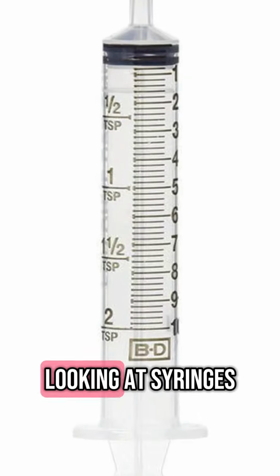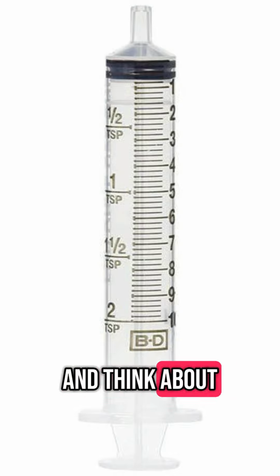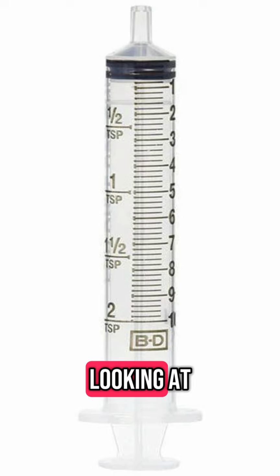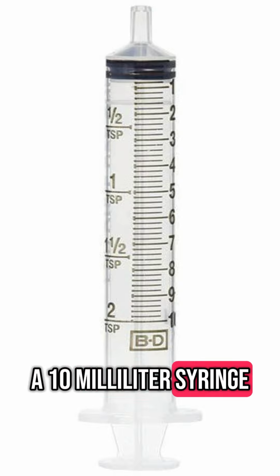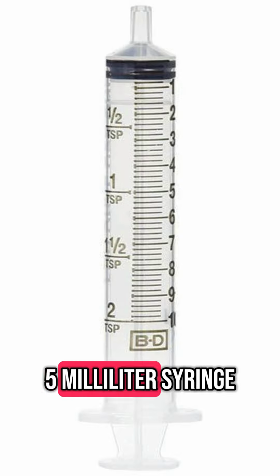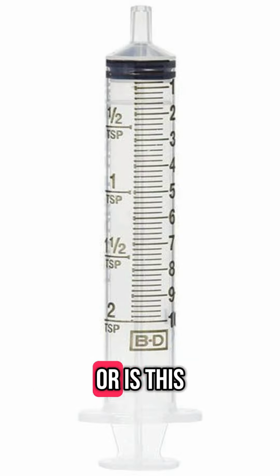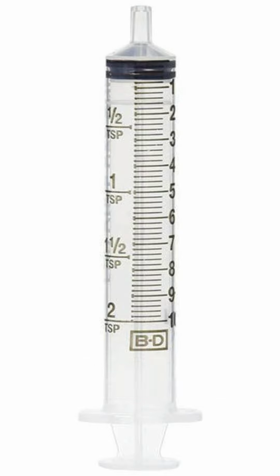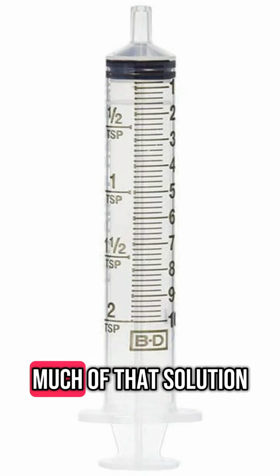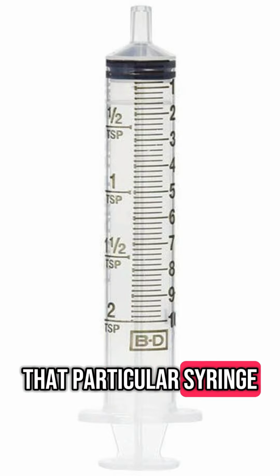So whenever we're looking at syringes, I want you to always stop and think about what type of syringe I'm looking at. Meaning, is this a 10 milliliter syringe? Is it a 5 milliliter syringe? Or is it a 3 milliliter syringe? Or is this an insulin syringe, etc.? That will let you know how much of that solution you can draw up in that particular syringe.